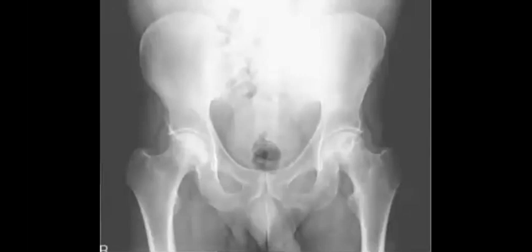If it is steroids, you will search for renal transplants. If it is alcohol, you will search in the abdomen X-ray for pancreatic calcifications. If this patient is diabetic, you will search for any vascular calcifications. Then sickle cell, we mentioned it before. Then trauma.